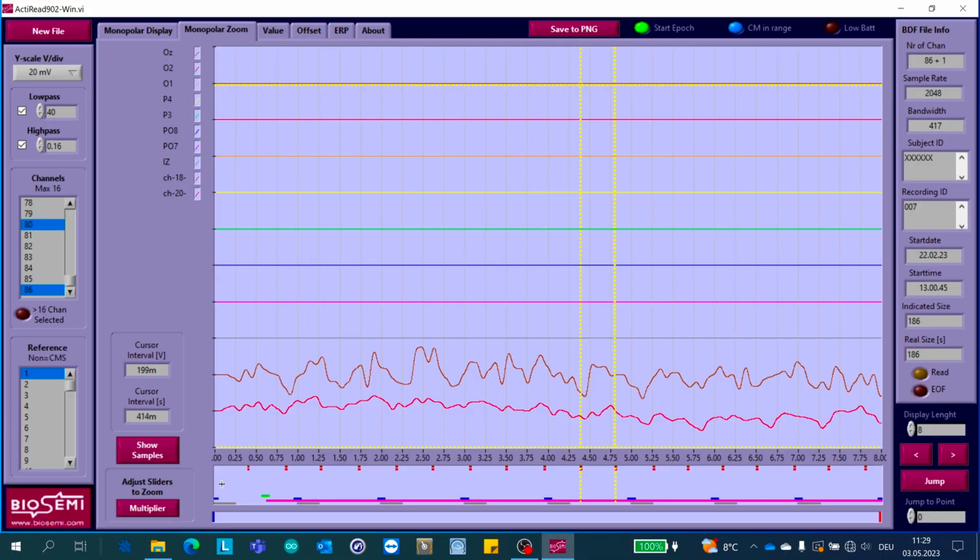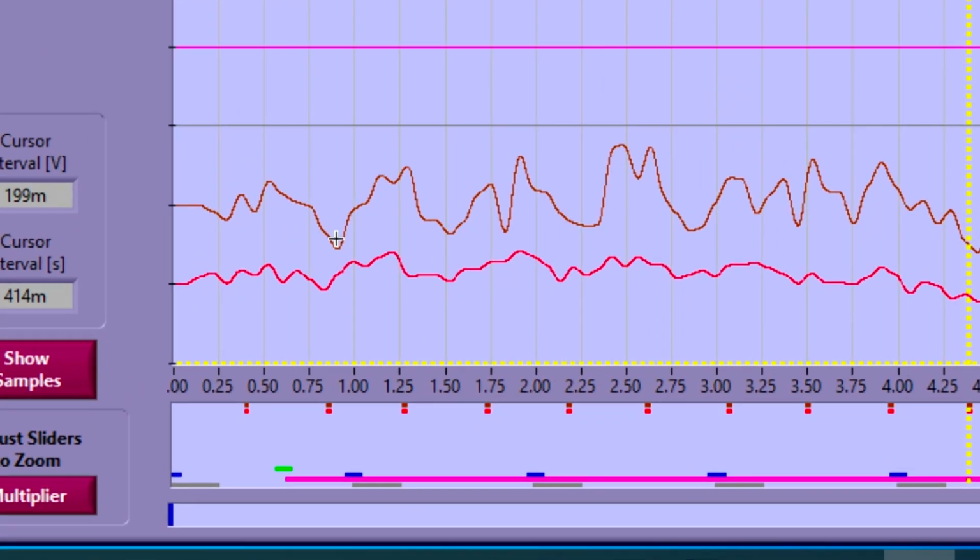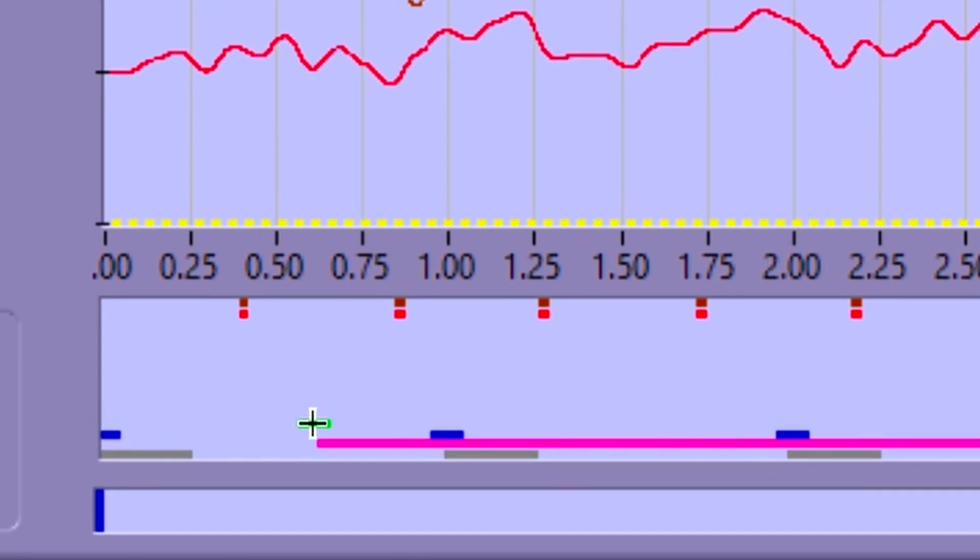Something that is probably unclear when you actually look at the bottom here. You can see, don't worry about the blue one, but see just the green one, the purple one, and the gray one. The light NIRS triggers on an upgoing 5-volt trigger on an edge. As soon as it actually triggered that edge, it samples that trigger at 13 Hertz.